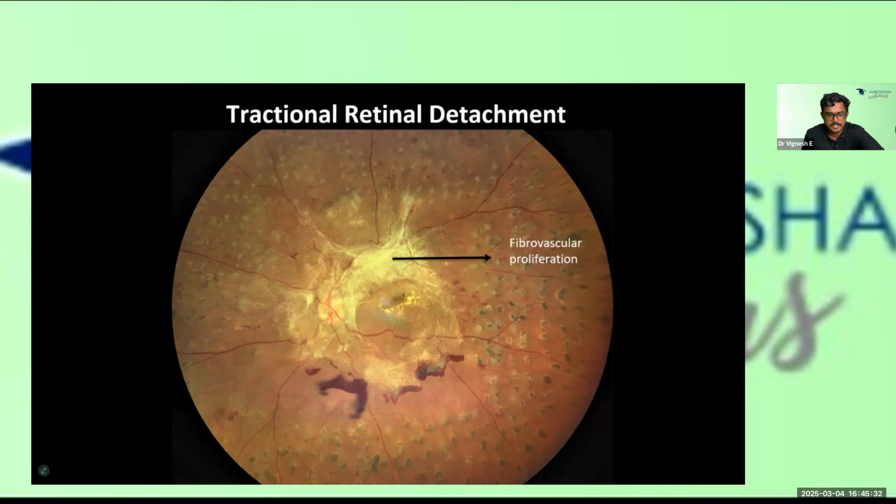So previously, when talking about diabetic retinopathy, I had said that fibrovascular proliferative membranes can be present, and if left untreated, these membranes can contract, causing a tractional retinal detachment. This image shows a thick fibrovascular proliferation on the ST arcade with an underlying macular tractional retinal detachment.